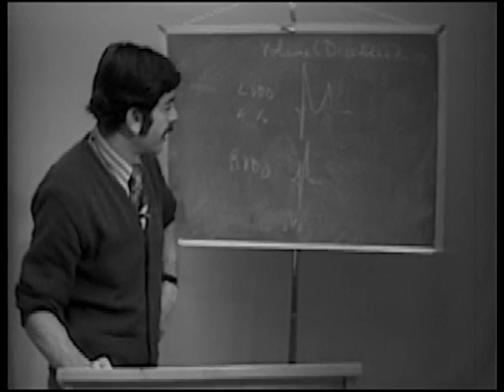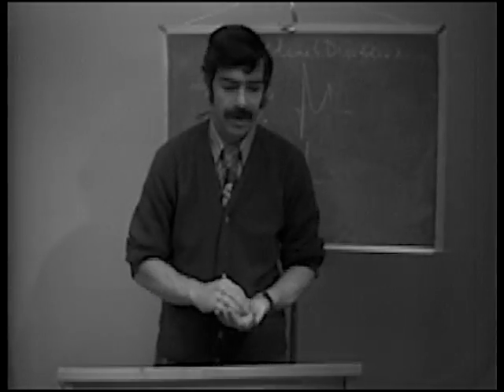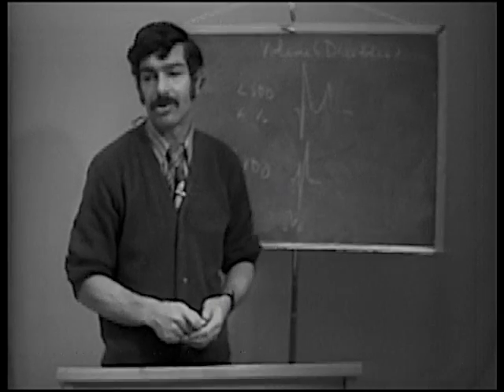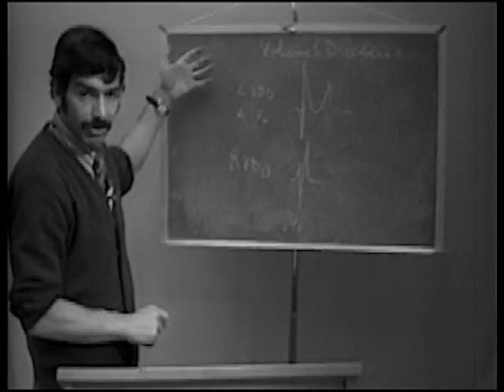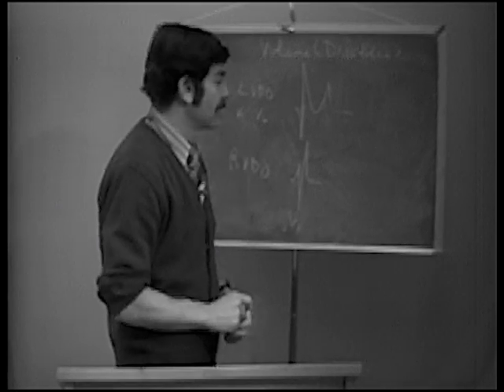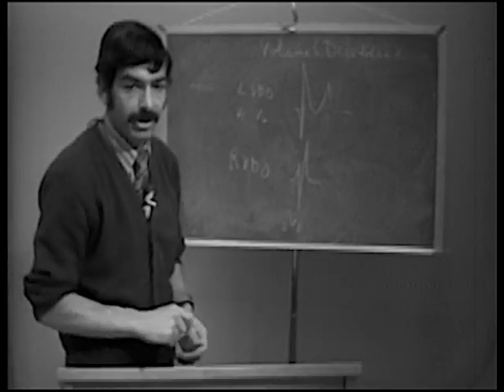Okay, I should also point out that in patients that have volume overload, if this is persistent and continues for many years, the pattern will eventually change to looking like a pressure overload type pattern. In other words, you'll get the other criteria that we just talked about for pressure overload: voltage, axis, intrinsic deflection, ST-T wave changes. So in congenitals, as they go on later and later in their disease, they may develop the signs of pressure overload on the electrocardiogram.